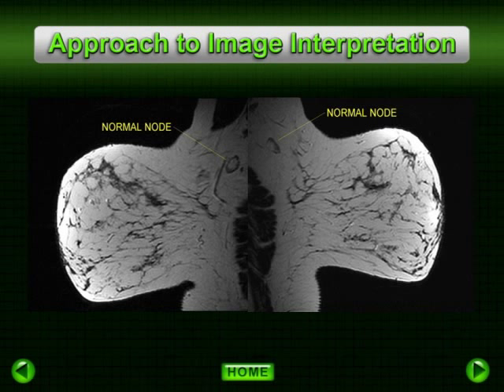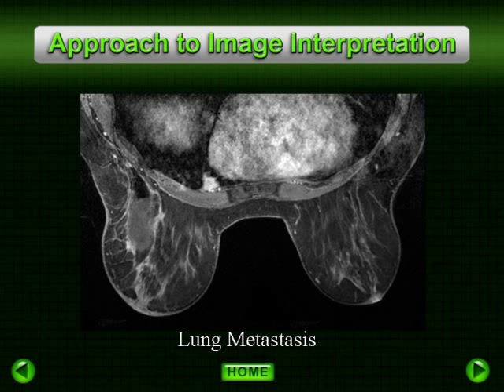In addition to simultaneously evaluating axial stir and T1 acquisitions, we will generally display as well a sagittal acquisition, which is usually performed at a high resolution. This can be performed with or without fat saturation. A CAD system can also facilitate cross-referencing a region of interest on your multiple orthogonal acquisitions. Don't forget on this initial unenhanced survey to look into the chest for additional information.